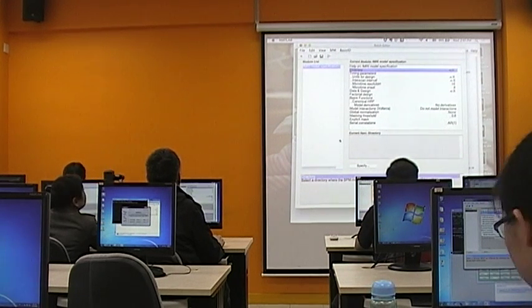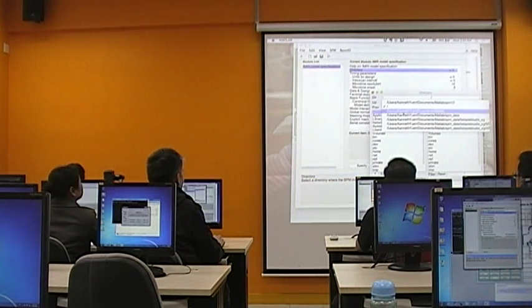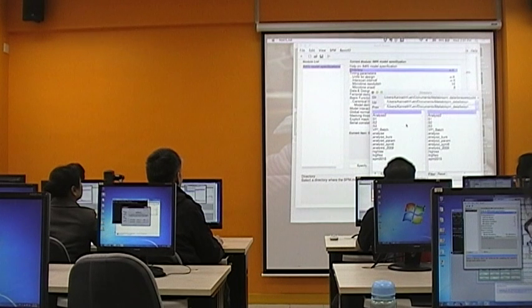So you simply choose a directory. Let's say I go to, for example, the SPM sample dataset, and you see the S1, S2, S3, which are the raw data for 3 runs, and the high resolution image.